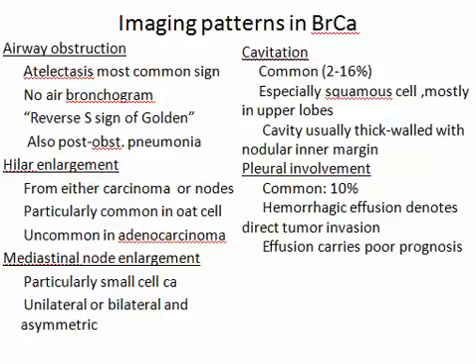I'll give you some hint about what we were seeing before in bronchogenic carcinoma in the chest X-ray. We were saying that we have a lesion at the hilum, simply if the hilum is prominent or if the hilum is dense.